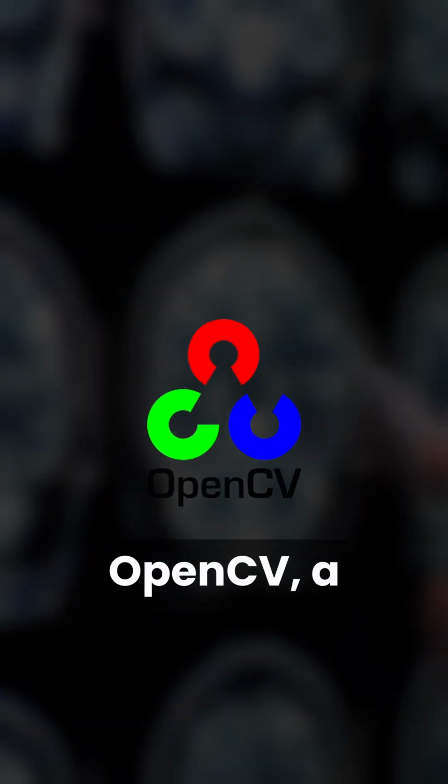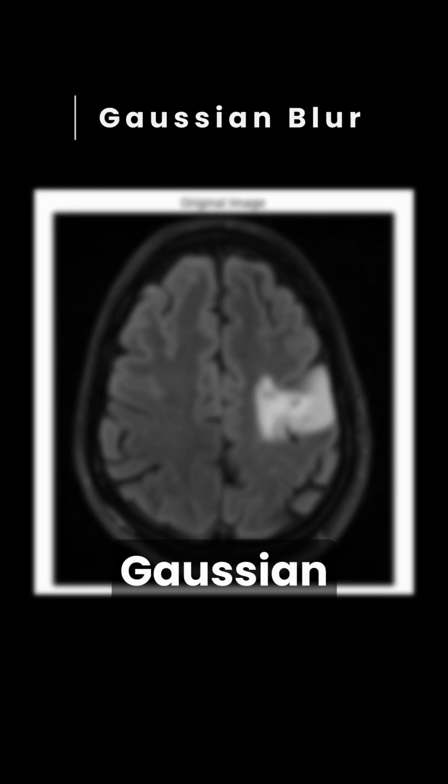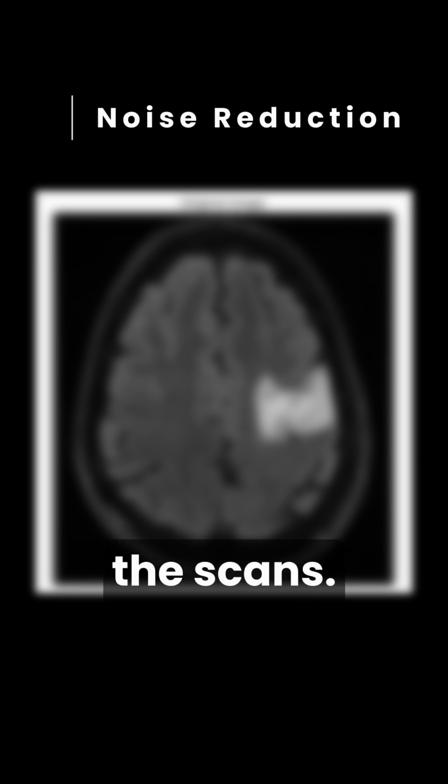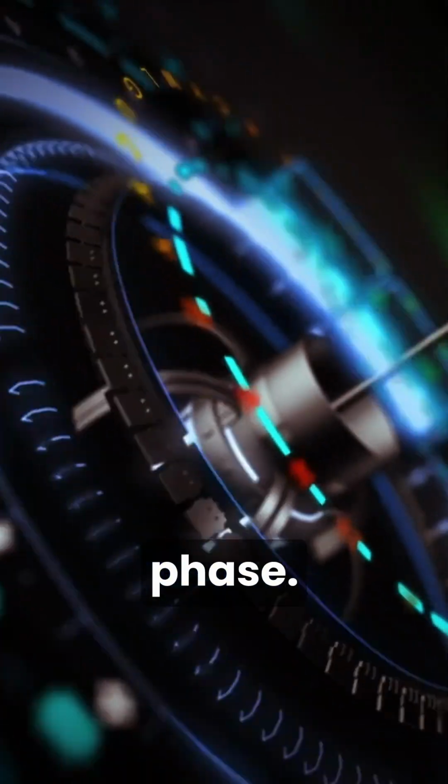We use OpenCV, a powerful computer vision library, to enhance our images. We apply techniques like Gaussian blur for uniformity and noise reduction to clarify the scans. Next comes the crucial feature extraction phase. Canny edge detection then identifies boundaries between tissues, often indicating tumor edges.